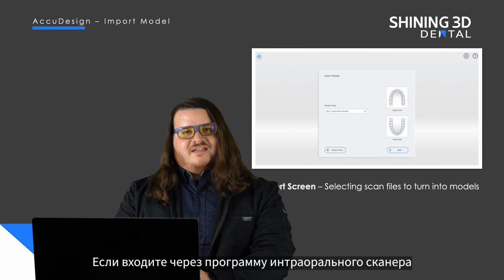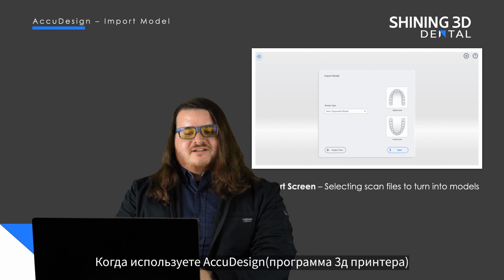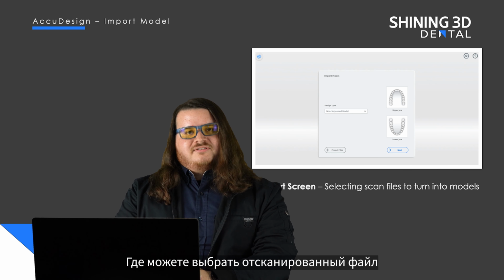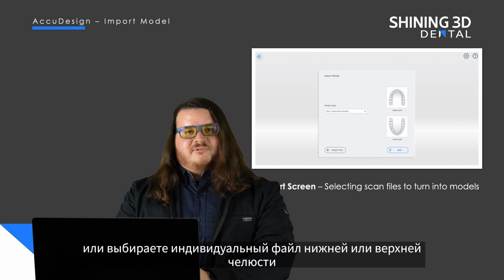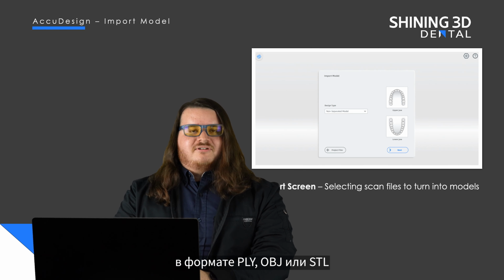If you are using the scanning software version, you will already have your scanned data imported into the module. If you're using AccuDesign, you'll have an Import Project Files button, which you can select any scanning project file from one of our scanning softwares. Or you can select the individual upper or lower jaw to import using any scan data in the PLY, OBJ, or STL format.